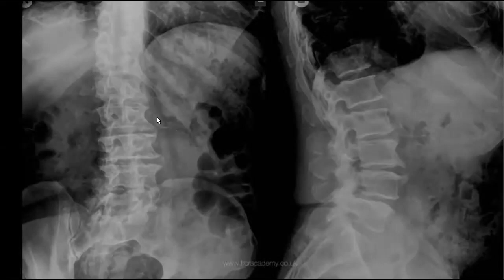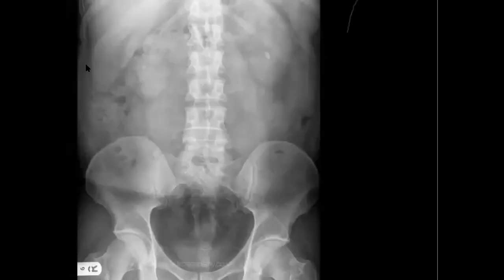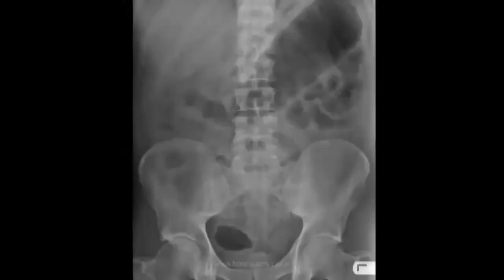You find the calcification of the aorta, so abdominal aortic aneurysm. Okay, and here, this one is easy. Bilateral renal calculi. So everyone score it, nice.